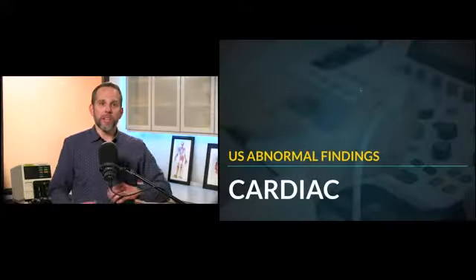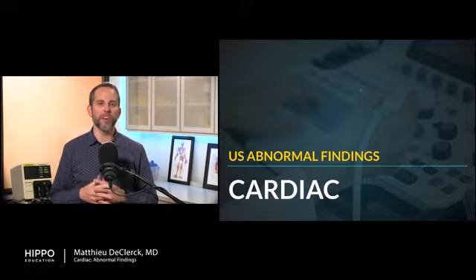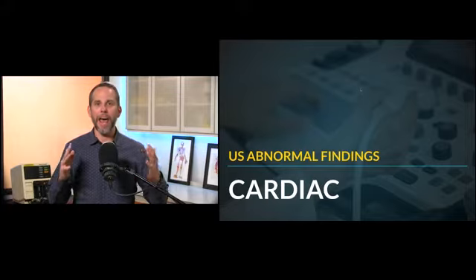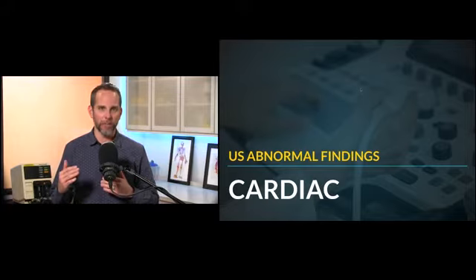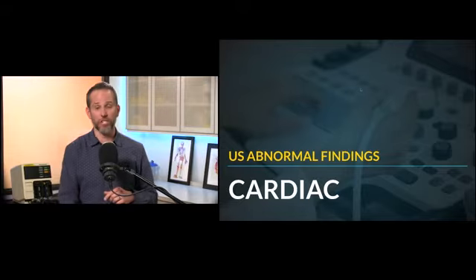The big segment: the ultrasound abnormal findings on cardiac. Cardiac ultrasonography is very, very helpful and used very, very frequently. But I just want to go over some of the big picture things. We're not doing cardiac echo on a cardiology level, but there are some things that we can make decisions on, and I think it's just a good review of that.